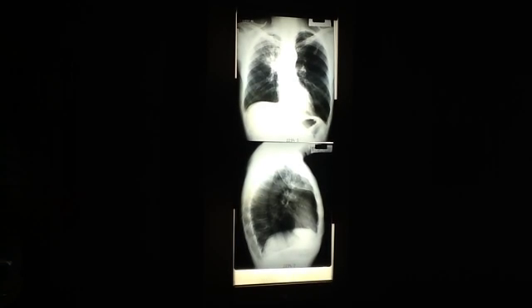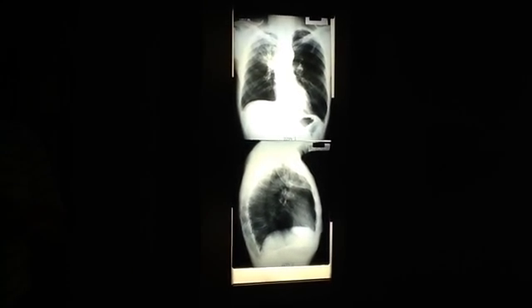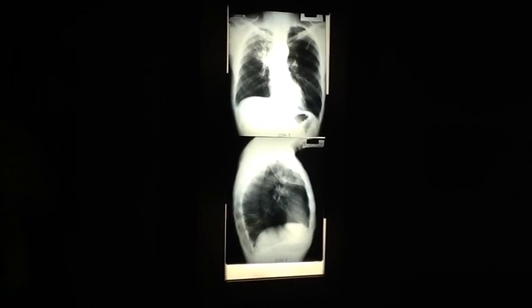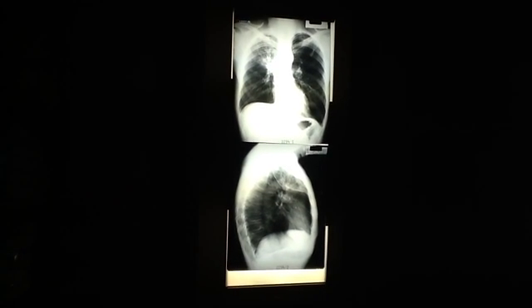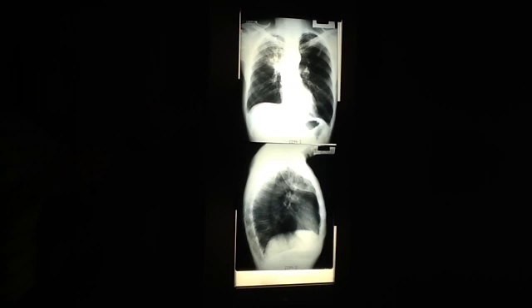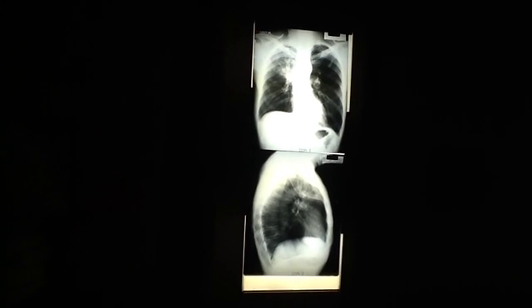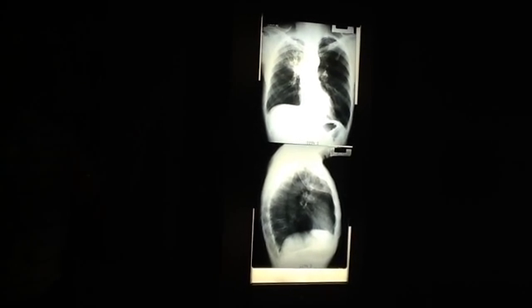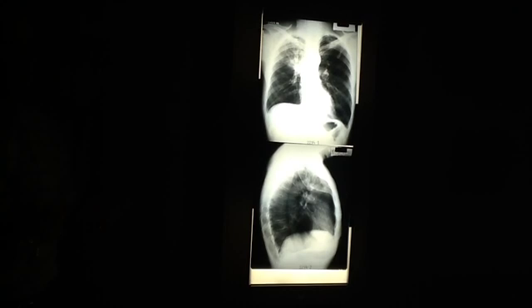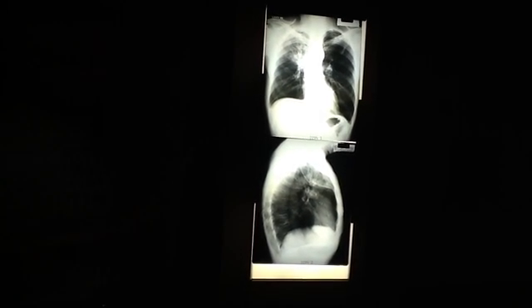If the patient is an adult and they're over 40 and they look like this, they have a tumor until someone says no, they don't. The working diagnosis is endobronchial tumor because it's such a common cause of resorption atelectasis in adults. Now, it could end up they have asthma because asthma will do this in an adult just like it'll do it in a child. But if they smoke and they're over 40, bingo, home run. They have lung cancer until proven otherwise because it's such a common cause of atelectasis. Perfect example.